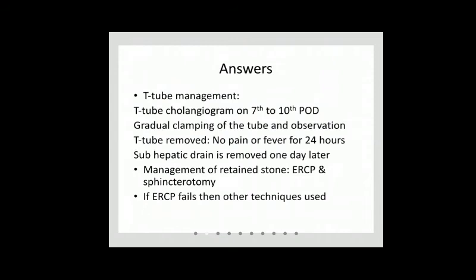So what are the important findings on ultrasound? What are the ultrasound findings in case of gallbladder stone? Shrinkage of the gallbladder, thickening of the wall of the gallbladder, and echogenic structure in the gallbladder. But what is the most important finding in case of common bile duct stone? Dilatation of the biliary tree. Very good. The most important is the dilated common bile duct.